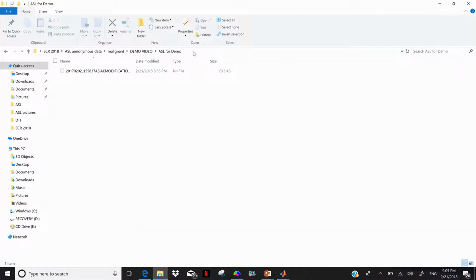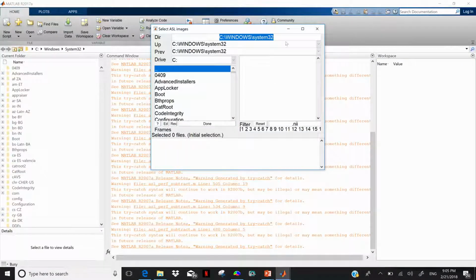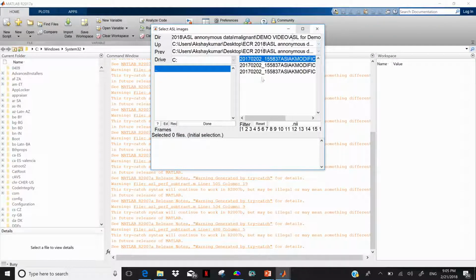So you just copy paste this little guy on that. It's quite easy. Just copy. Sorry, these are like little things which before you do it. Yeah, got it.